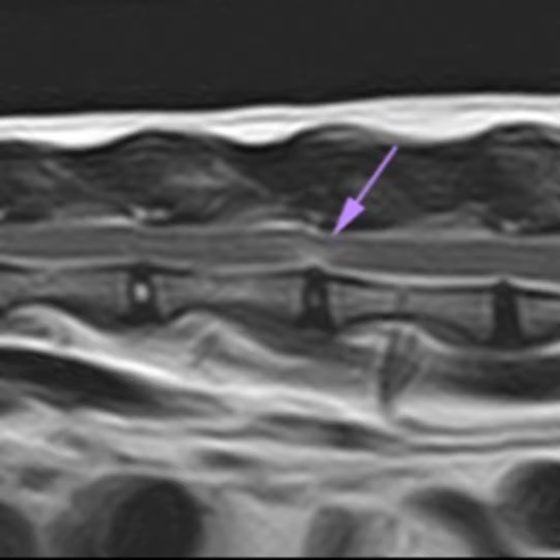The most frequently affected intervertebral disc in our population was L7-S1, followed by the thoracolumbar junction, so the discs from T11 to L2, and L4, L5. These findings are in agreement with previous studies, with the higher predisposition of this feline spine location to intervertebral disc herniation. And this finding probably could be related to the peculiar vertebral column configuration.